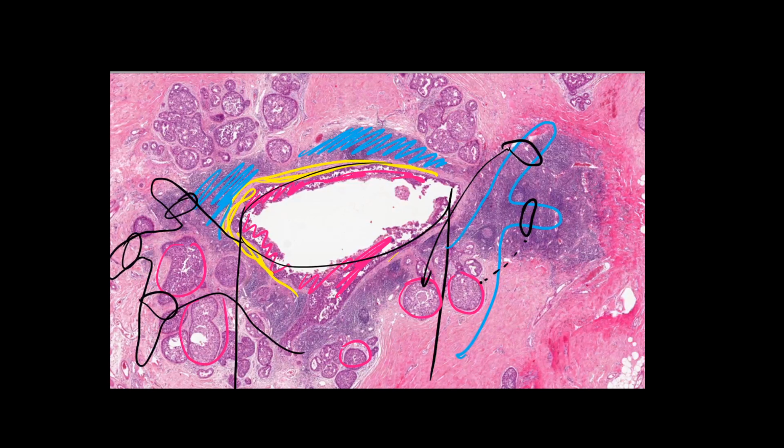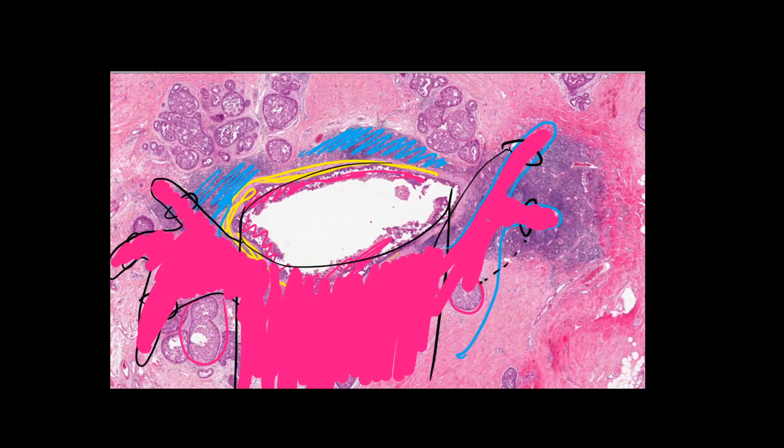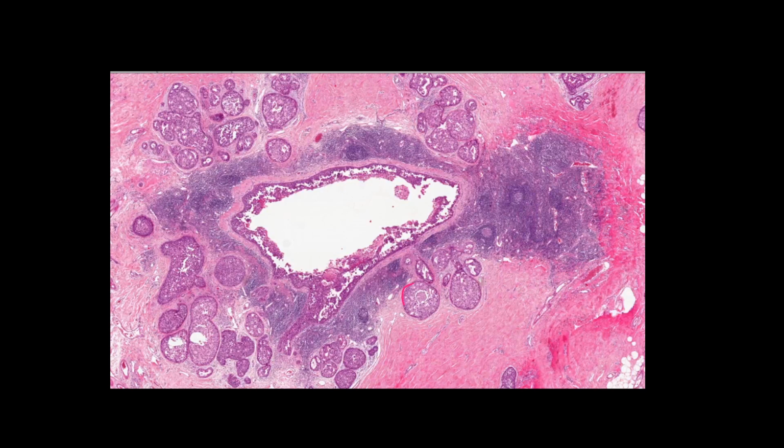It's a contiguous tissue, the original duct in the middle, the side branches on the side, and of course all of them are filled with cancer cells. This is a demonstration of neoduct genesis. Now we understand much better what misleads the pathologist who calls it multifocal. Look at the ring-like slices on one arm and another and a fourth and so on. This is again without drawing.